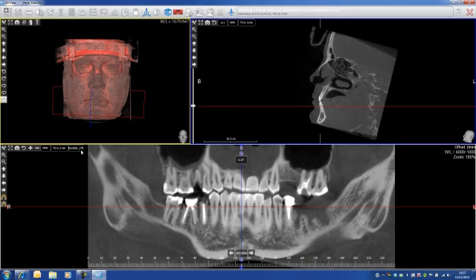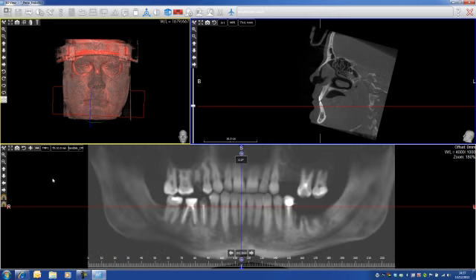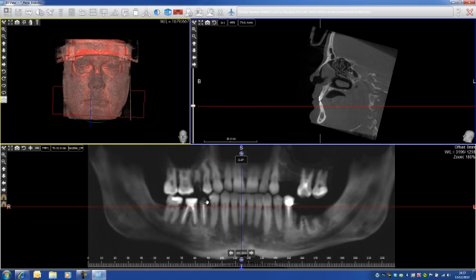Perfect. Now I use the filtering panoramic image. I can play with the contrast a little bit here, always with the left click. I can clearly see my mandibular canal on both sides, which is good. Okay, I select contrast, and now I'm going to generate my cross section.